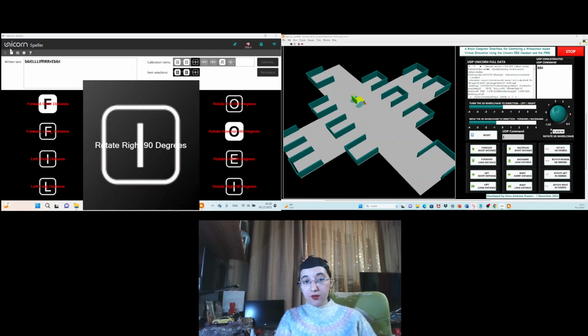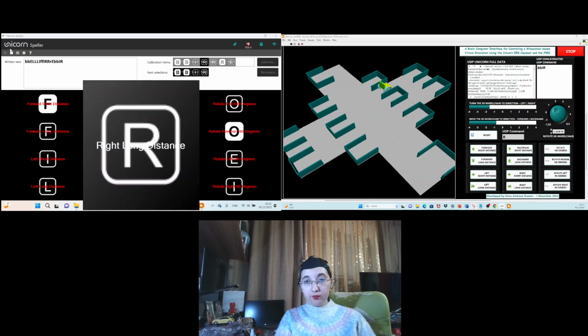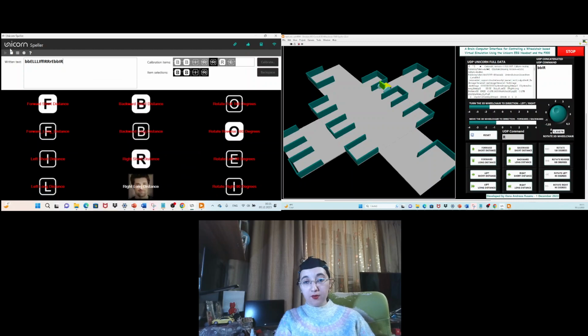Perfect. Then continue with right long distance 2 times. Perfect. Again, I will select the same command, right long distance.